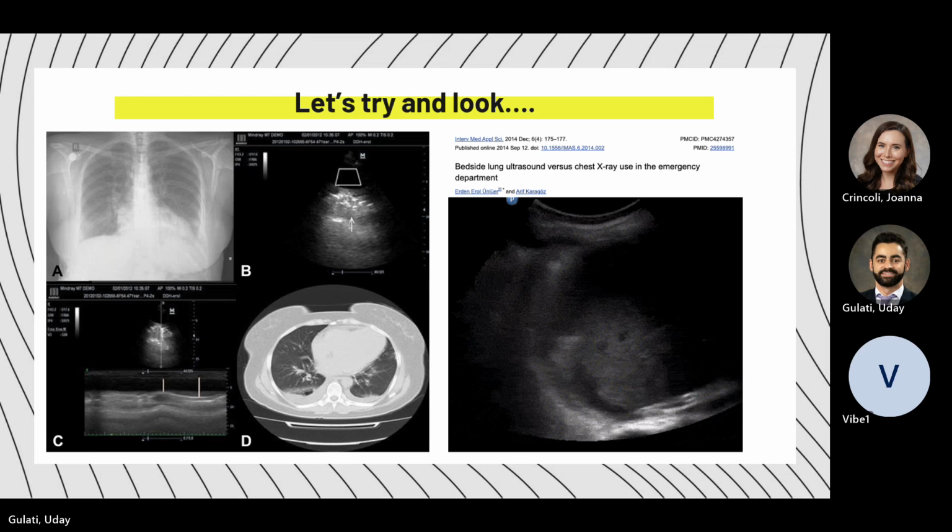So, just looking, what do you see on the chest X-ray? Ignore everything else and just purely focus on the chest X-ray. Effusions on the left. Sorry? Pleural effusions on the left. Light trace, maybe some bilateral or right side as well, trace. And I can't see too much else. Right. That sounds like Sanjay, is that correct? Yeah. Hey, man. Yeah, so absolutely could be, right?